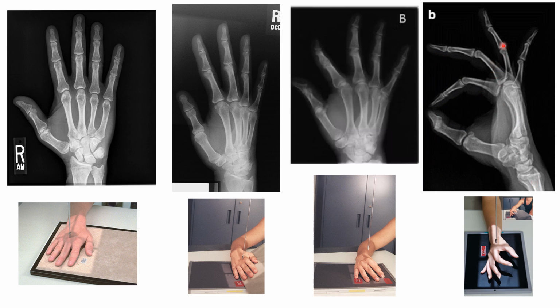We want to be able to see those open joint spaces again. One of our criteria for positioning the fan lateral hand is for the outstretched phalanges to remain parallel with the IR. If they are not, then those joint spaces will close up, much like we saw in this oblique position.